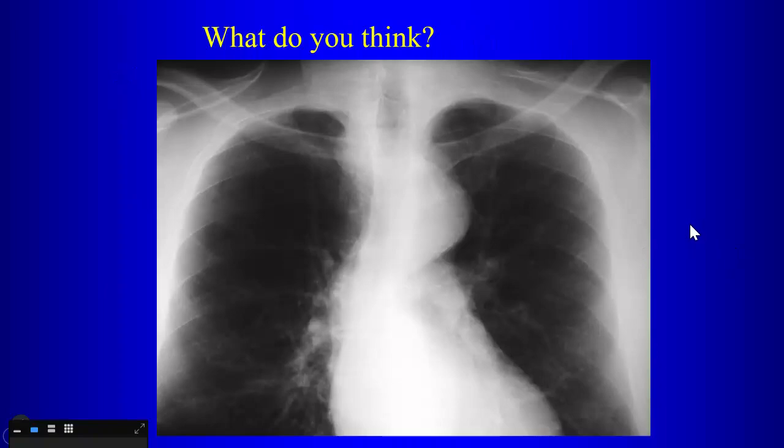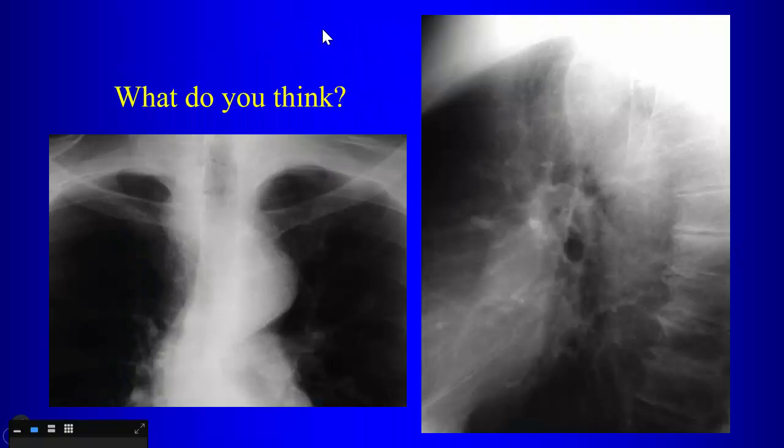arch anomalies. So here we have a very prominent aortic knob here. It's kind of funny-looking structure here in the right paratracheal region. The lateral view, though, is very helpful in this case. So what's the finding on the lateral view? What is it showing you, and how does that help? Tracheal narrowing? Not so much tracheal narrowing as what? Tracheal bowing, right. The trachea is bowed forward. So there's an opacity back here. Whose triangle is that? Raider's triangle, right? There's an opacity back there in Raider's triangle.